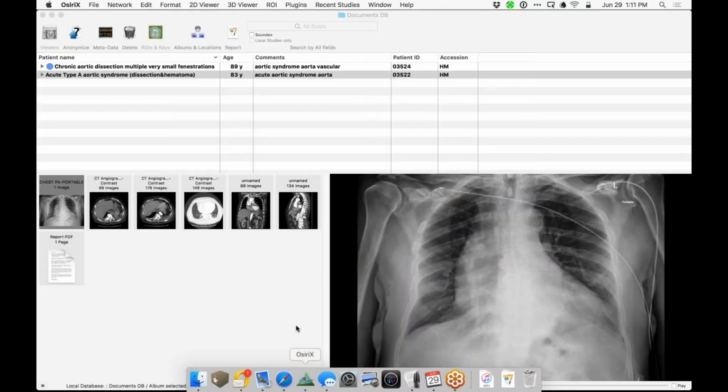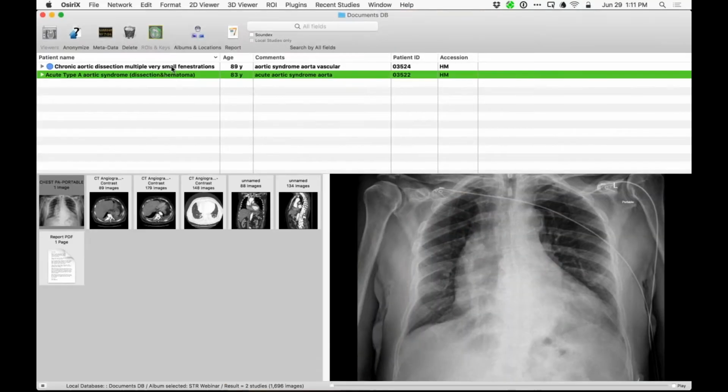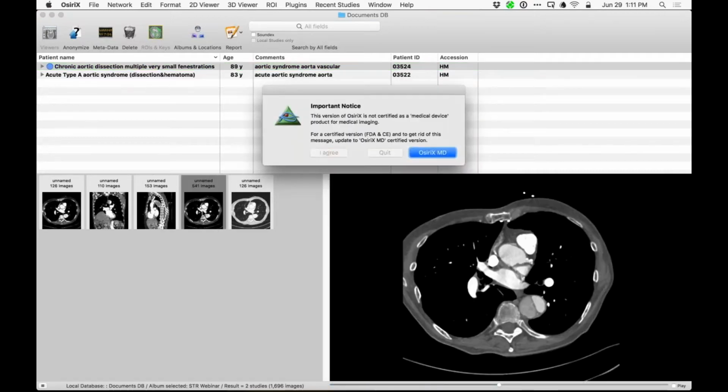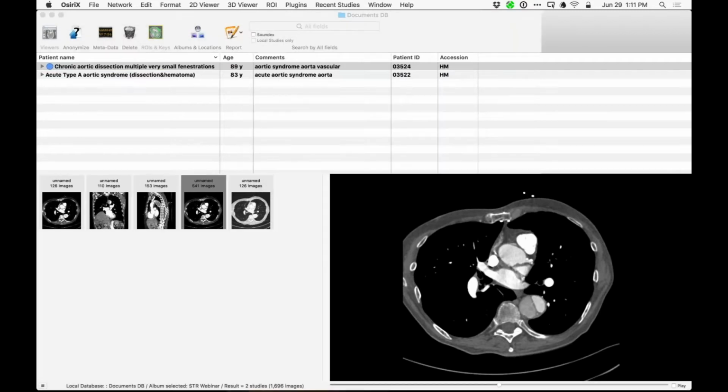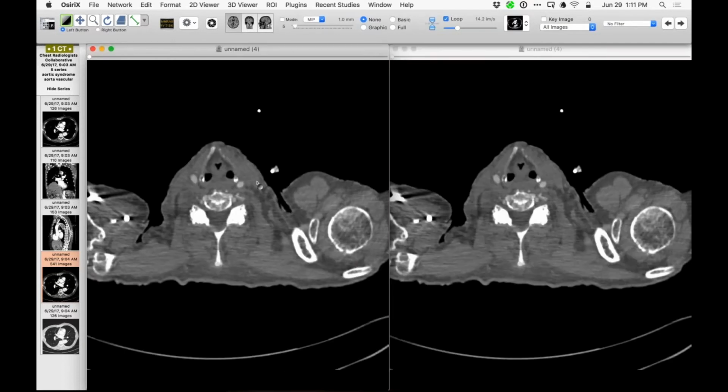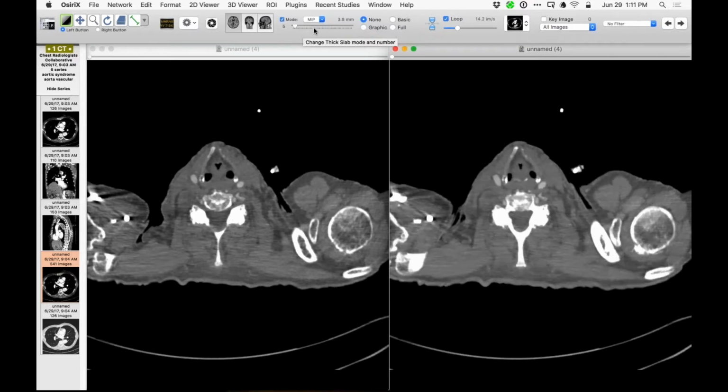So this one is interesting. I haven't noticed this before, and I want you to confirm the observation and see what you think. So let me bring up 2 images side by side, and one of these I'm going to make a MIP image just to try to bring out what I'm going to show you.